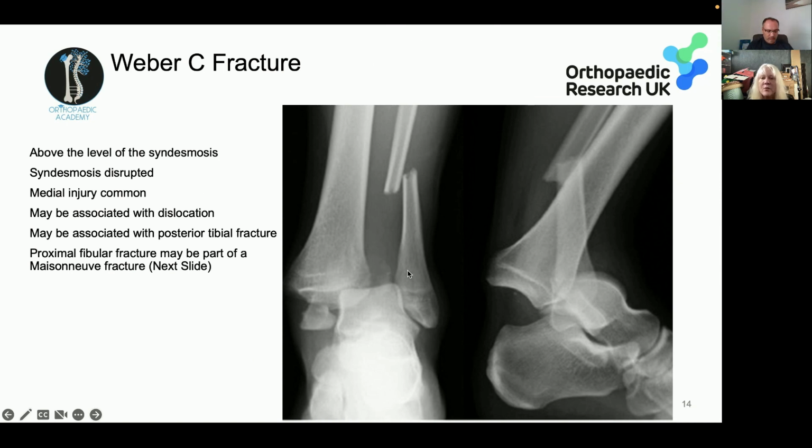You've got widening of the ankle syndesmosis, also known as diastasis, which means the two bones have come apart. And in this one, you've also got a fracture of the medial malleolus. And then if it couldn't get any worse, the ankle is dislocated. So here is the distal end of the tibia with its nice dome, and here is the talar dome, which should be sitting underneath here. So this is a fracture dislocation of the ankle joint, and this needs to be reduced. I mean, we wouldn't expect you to be able to do a closed reduction to reduce the whole fracture, but what we want to do is get the ankle located and take the pressure off the skin on the medial side. This ankle will look very deformed and it will be very painful.